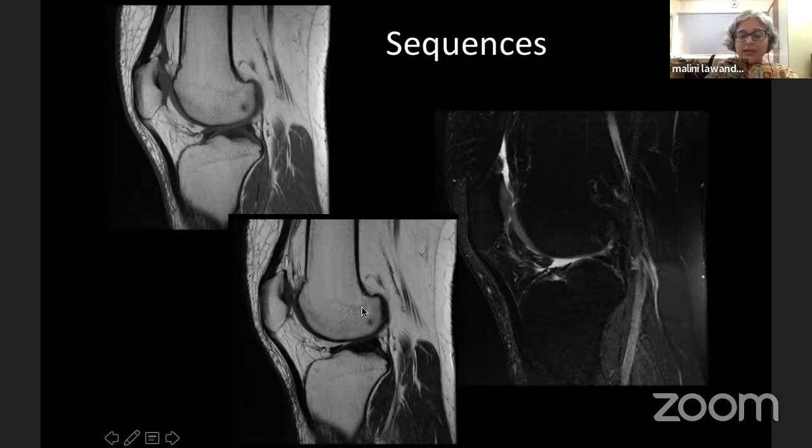But when I look at a T2 weighted image, the marrow is already fatty, which is bright, and most of the pathologies will have some amount of edema or increased fluid content. So majority of them look more bright on T2. Bright marrow, bright lesion, I can't differentiate between them. So I need to find a way, which is a T2 weighted image where fluid remains bright, but I need to make the fat dark.